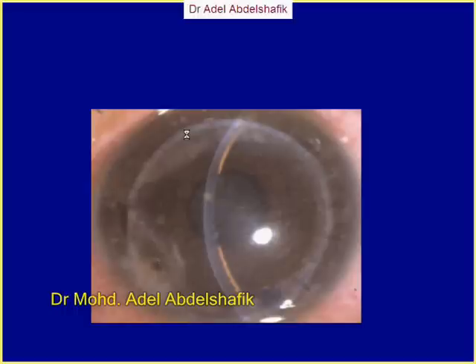What do you see in this image? It's a keratoplasty, I agree. You can see a ring here and you get the stitches all over. Yes. First notice the section in the cornea here and here and here. What do you notice here? The thickness here compared to this part. It looks that the lower part is thicker. Then you see these are folds in the Descemet's membrane. You can see them here in a section and you can see them here linear.